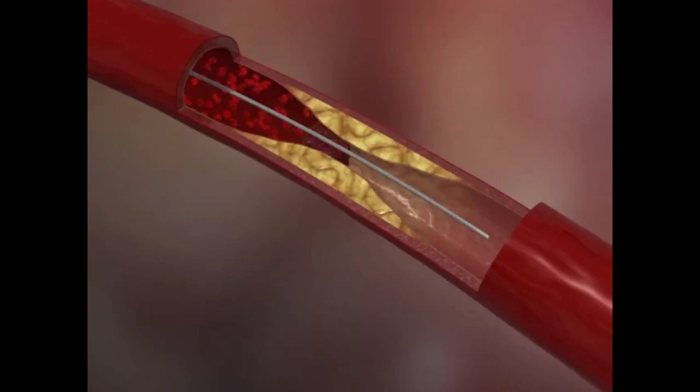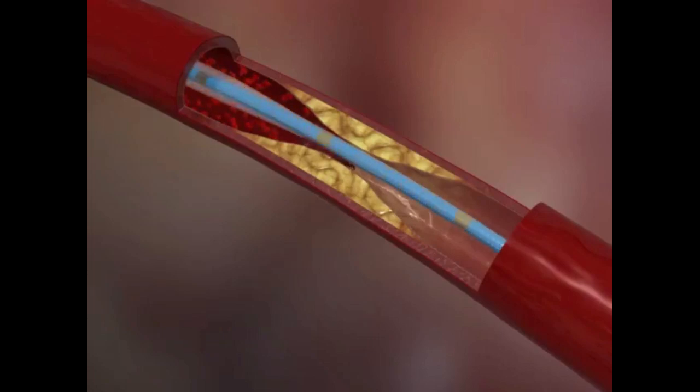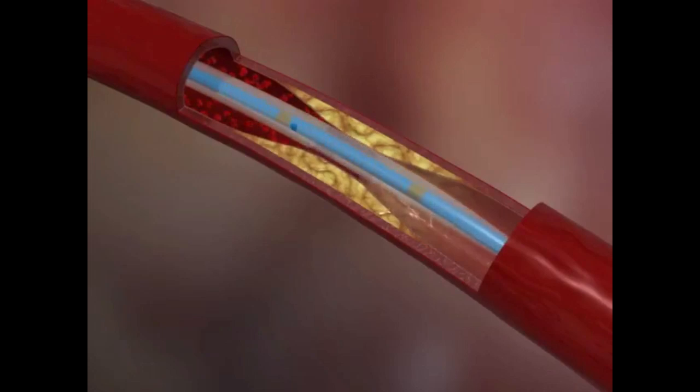After the guide passes the occlusion, the catheter is inserted past the 4th radiopaque marker. This makes it possible to rechannel the artery by means of the Dotter effect thanks to the conical shape of the Amicath, providing access to circulation distal to the occlusion through the perfusion holes.